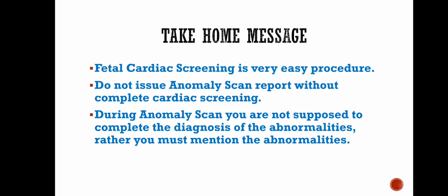Fetal cardiac screening is not difficult when performed systematically. Never issue an anomaly scan report without evaluating the fetal heart comprehensively.